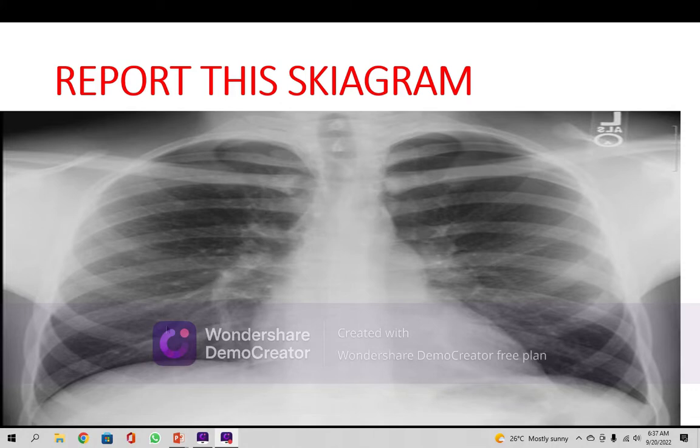This is the hilar divisions and bronchovascular markings coming out to this one, this one, this one. On the left side it is always present, always. On the left side you see no. This part there is slightly more aggregation of the bronchovascular markings. I don't know whether the patient is a smoker or not. To me it seems to be, because it has got the middle zone involved and the hilar middle zone involved also. I think it is smoker's chest. So there is no abnormality in the.